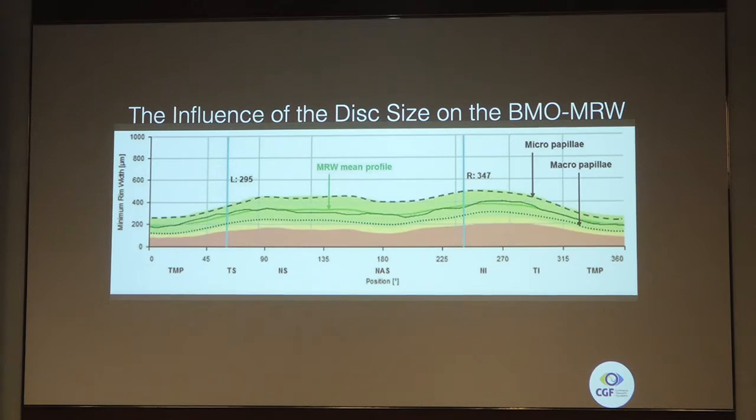That's why you see here in this B-scan map, in the micropapillae, the thickness is going to be much higher. And you see in the macropapillae, the thickness is lower. So it is just lying below the green line of the baseline, but it is within the green line itself. It is not touching the yellow or the red. So this is one thing which you will have to understand. Sometimes when you see this is down, you should not think the patient is having damage. At the same time, when the micropapilla is arranged here, then you should understand that there is something going on also.